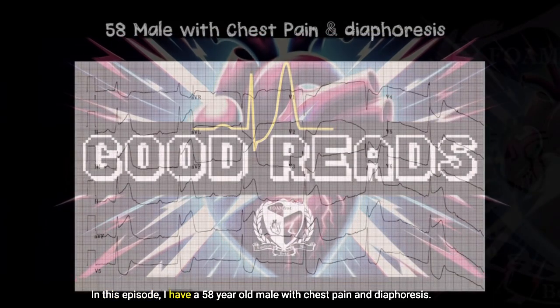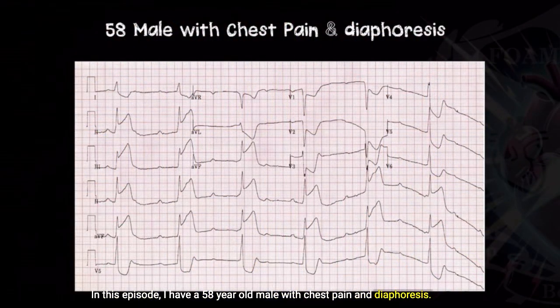In this episode, I have a 58-year-old male with chest pain and diaphoresis. When we look at the 12 lead, I think we can all agree that there are pretty obvious ST segment elevations in the inferior leads, 2, 3, and aVF. This is a pretty obvious inferior STEMI.